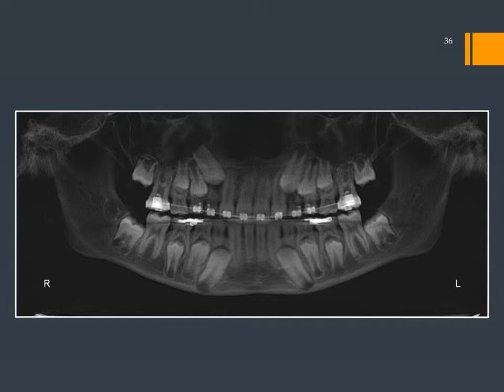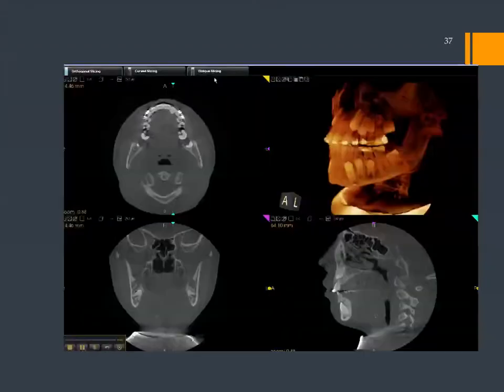So we're looking at the pano that's extracted from the 3D X-ray, and well, the upper right canine root is still kind of tipped in towards that lateral. The left one's still more vertical. You can't really tell if there's any damage going on there or any risk of damage. So we got our 3D x-ray and found that, well, in fact, it was pretty obvious to see that the canine tooth is sitting right on top of the lateral incisor.